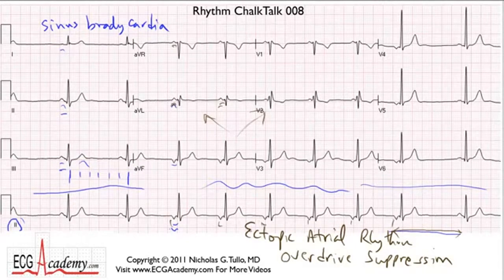That's why you don't have these ectopic atrial beats all the time, because the sinus node usually keeps them suppressed, because the sinus node tends to fire faster. But here, what do we have? We have a sinus bradycardia. It's very slow, I mean to say. And so that allows some of these ectopic atrial foci to gain footing and create these arrhythmia problems.